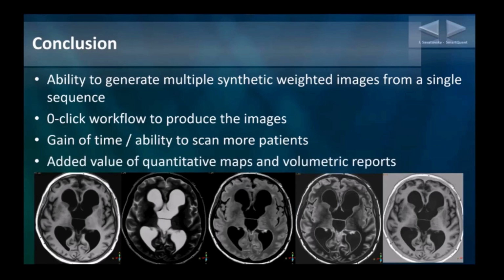With that same acquisition, we can have the added value of quantitative maps and volumetric reports. And I hope with my examples that you are convinced that it's a real added value in some clinical indications.